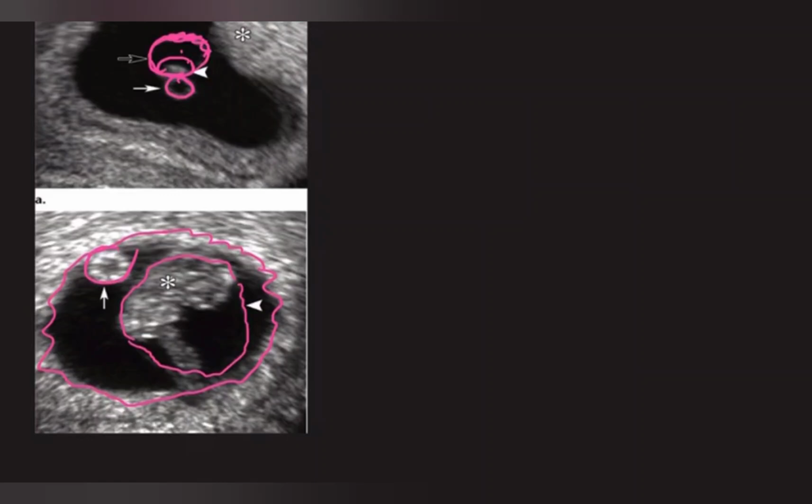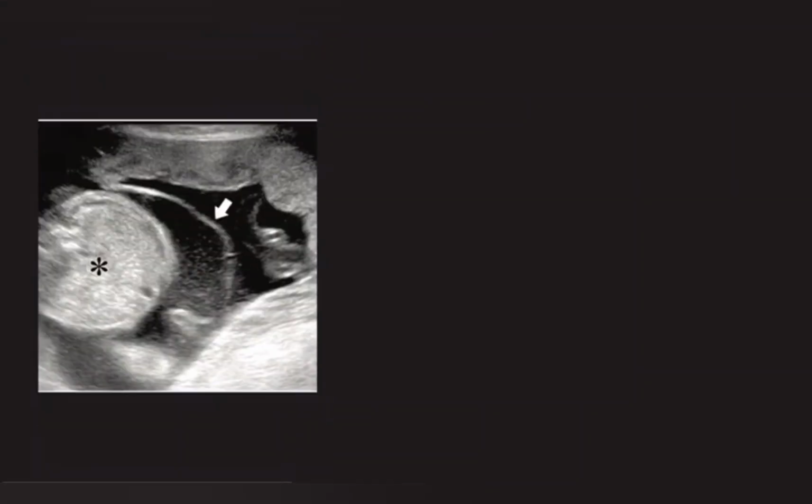Now let's discuss the basic membranes. So first is actually the amniotic shelf. We will look at all the membranes from 3-4 perspectives, like why they form. These amniotic shelves are actually formed due to pre-existing uterine synechiae. These synechiae can form after a previous pregnancy, previous cesarean section, D&C, or any previous endometritis. In these situations, uterine synechiae form, and when pregnancy happens, the amnion and the chorion grow over the synechiae and form these membranes.